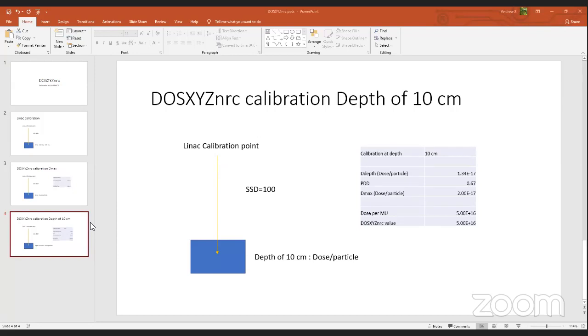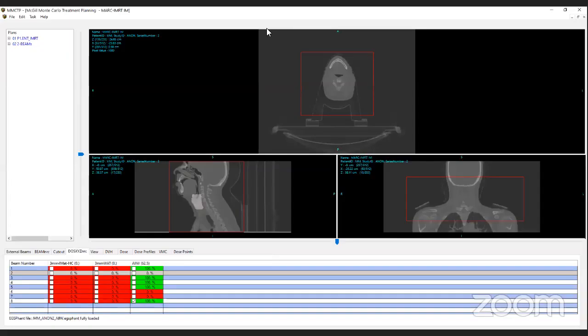So it didn't like that I had entered in a material that it didn't recognize. So I'm going to have to kill this. That's unfortunate. Yeah, I would use that option if I was creating a water phantom, and I wanted all of the voxels to be that exact same density.